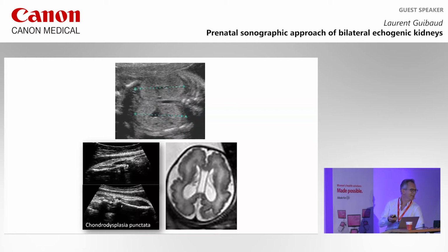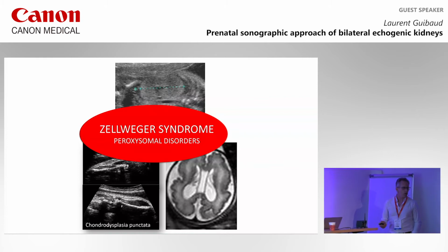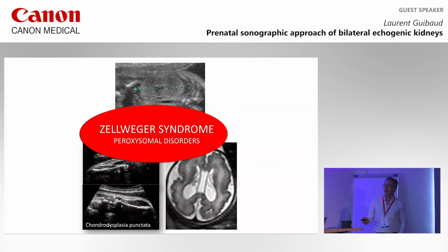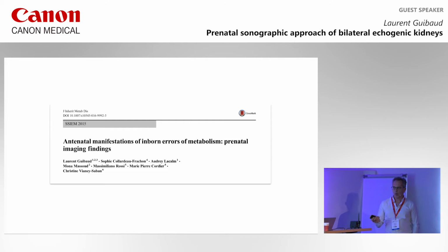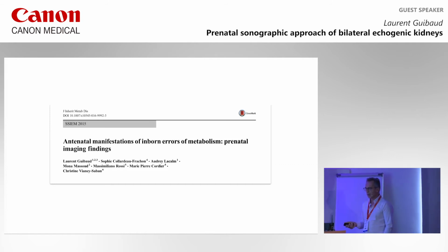Okay, this is very specific for a peroxisomal disorder. It's a Zellweger syndrome. And in fact, we wrote this article about the antenatal manifestation of this metabolic disease.